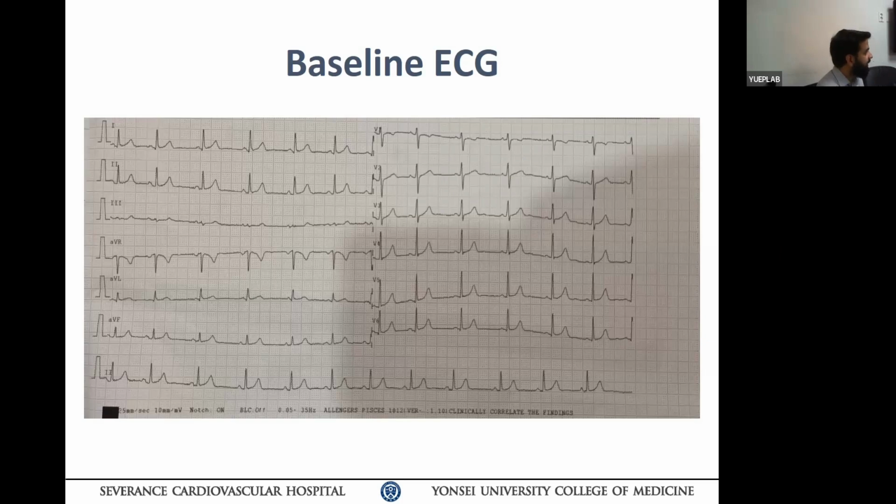We want to revise your diagnosis. So what are your comments on the ECG? Okay, who will start? Let's start from Oyundari. I can see sinus rhythm with about 75 beats per minute. And at the time, there is no delta wave and no short PR interval. And a slightly left axis deviation. There's no specific, no significant ST-T changes.